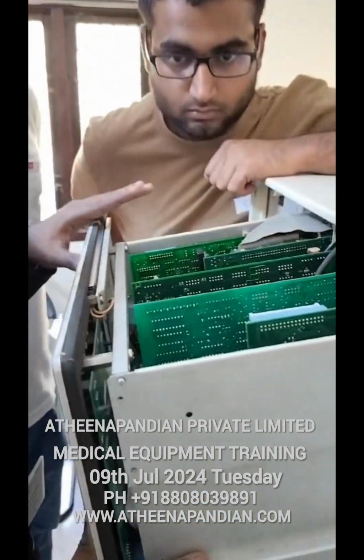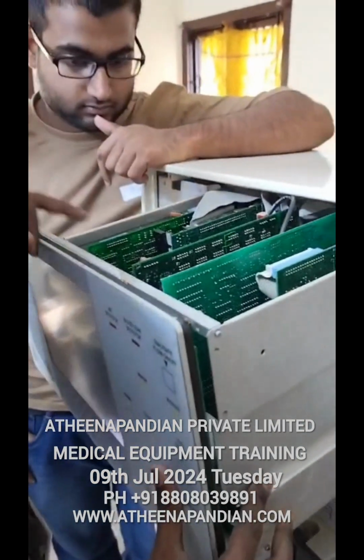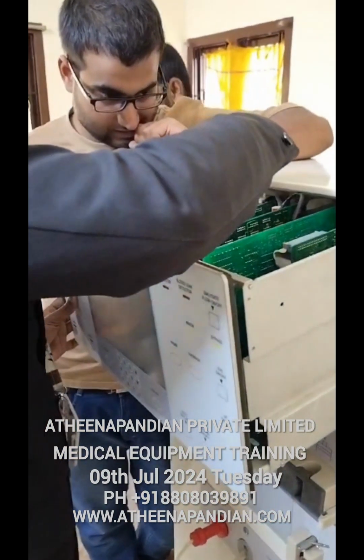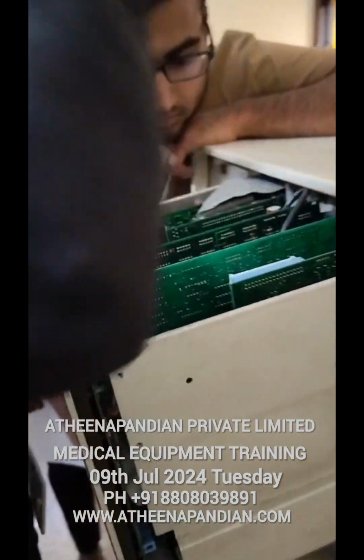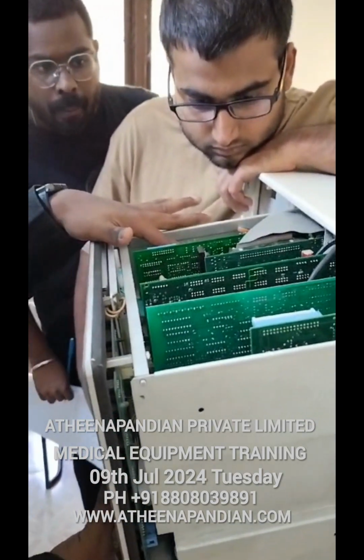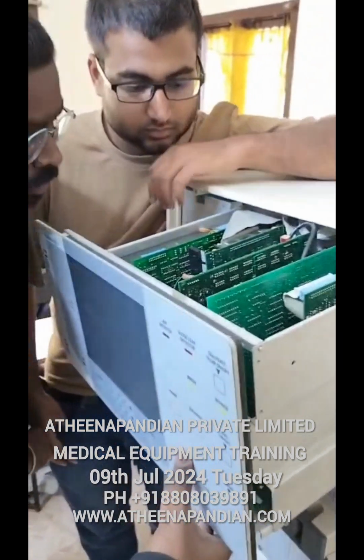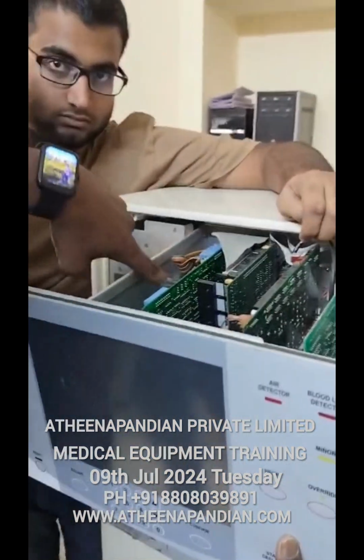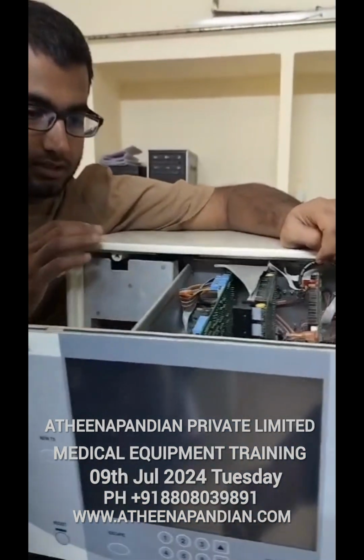First of all, the power supply, because we also see it in other equipment, like SMPS. Here you can see the power supplies are included, fully belonging to the transistors, and you can see the connections of transmission lines from the power supply. Then inside you can see 1000 microfarads and the 35 volt capacitors we are using. Inside, in blue color, you can see one electrolytic capacitor. You can see some electrolytic capacitors. What is it? That is the thing behind. Black color? Yeah, one second. This is one type of electrolytic capacitor you can see.